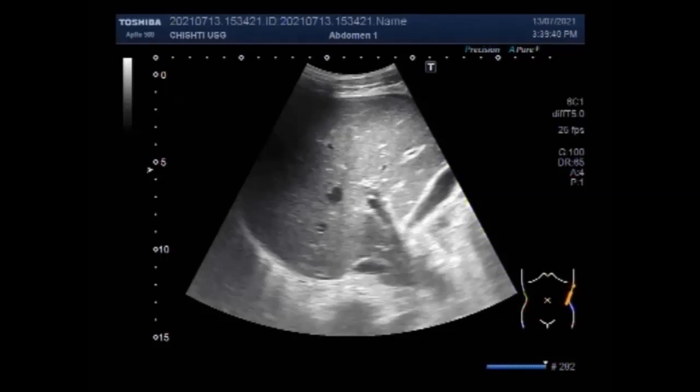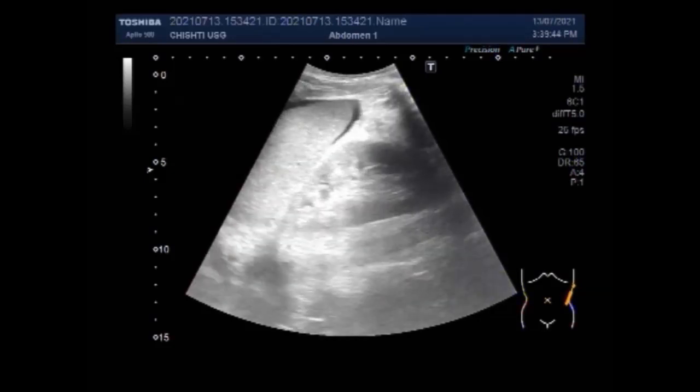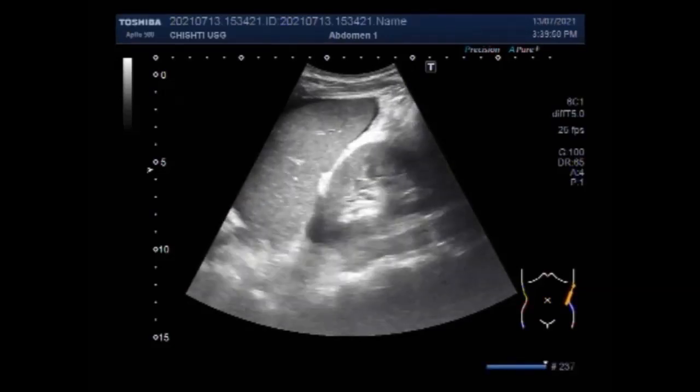Sonography is also able to detect primary ascarid perforation as two pairs of parallel lines representing the worm's outer margins flanking a central sonolucent line representing its digestive tract. It could be found also in the peritoneal cavity and in some loops of the small bowel.